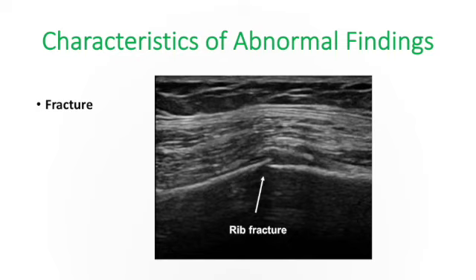This is a rib fracture. I always find this slide really interesting because it shows that we can view things like a rib fracture with diagnostic ultrasound, but we can also see how that rib fracture not only is so painful, because I've had rib fractures in my life and they hurt a lot, but also how it is piercing into the overlying muscle. It's really interesting to note these things because we can get a good sense of what our patient's going through with this sort of interface. Now, obviously, with the other imaging modalities we've looked at, like MRI, CT scan, X-ray, we're definitely not getting a picture like this.